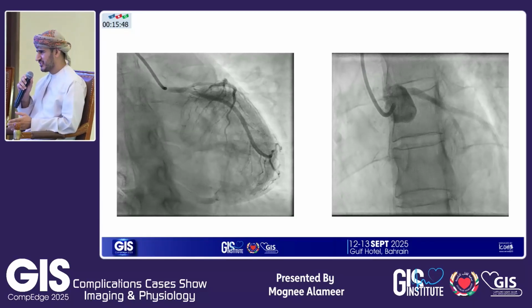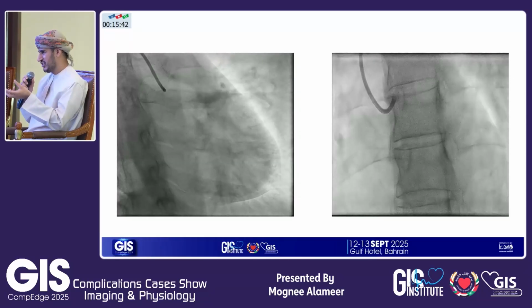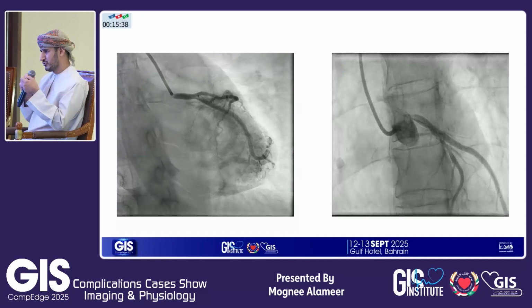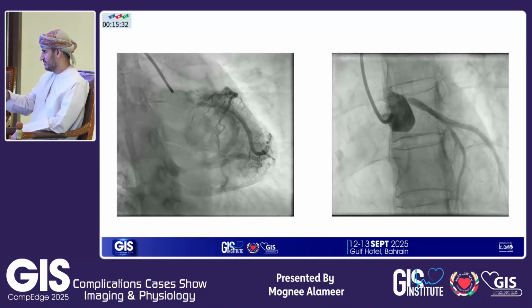But usually in ostial left main, we don't prefer OCT because the guide engages and the contrast will not opacify the ostium part of the left main. So usually the standard is IVUS. If I want to confirm in this case, maybe I'll go with IVUS.